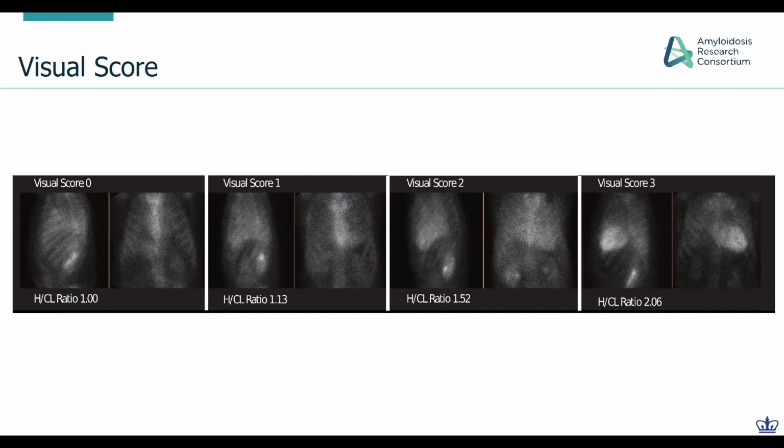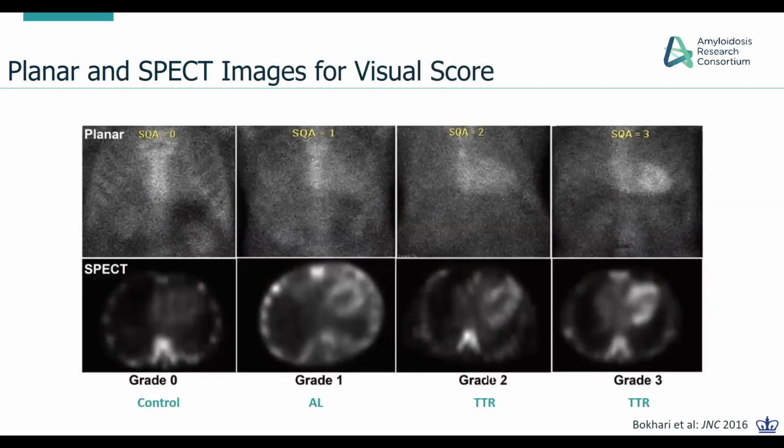But patients who have a score of 1 and 2 are the borderline patients. In some of these, you'll see a larger breast, or a lot of soft tissue, or pericardial effusion, or sometimes a large pleural effusion. In those patients, it's sometimes hard to look at myocardial uptake and draw your heart to contralateral ratio.